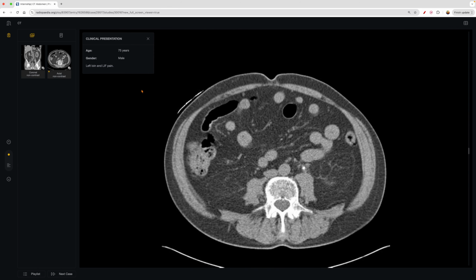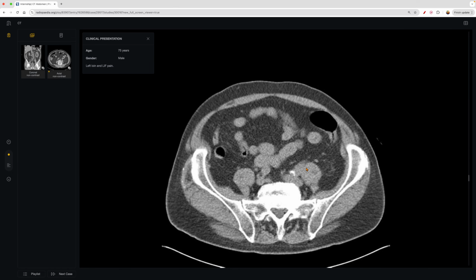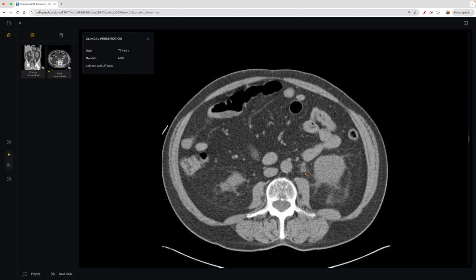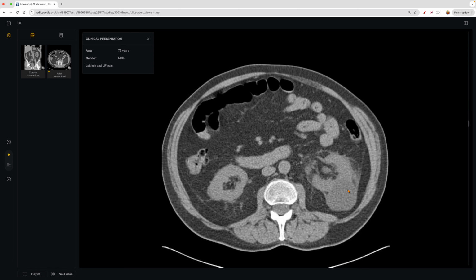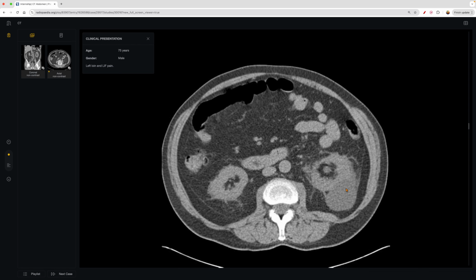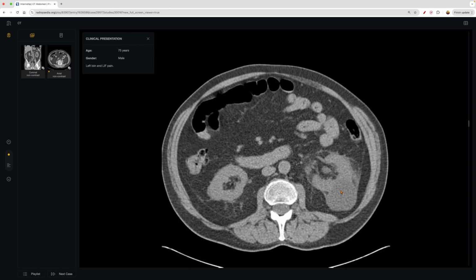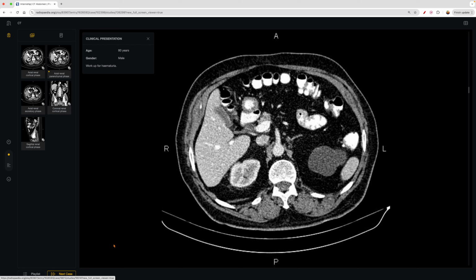And let's look at this from the axial perspective. And so there's your kidney stone. Go more inferior, not really appreciating much else. And then as we go more superior, following the ureter here, see the kidney. And then you can actually see here as well, there's something coming off the kidney. And we'll talk about that later, the differential of a cyst, abscess, or even neoplasm. Right, and then you can see the rest of the contents. So kidney stones are certainly common.